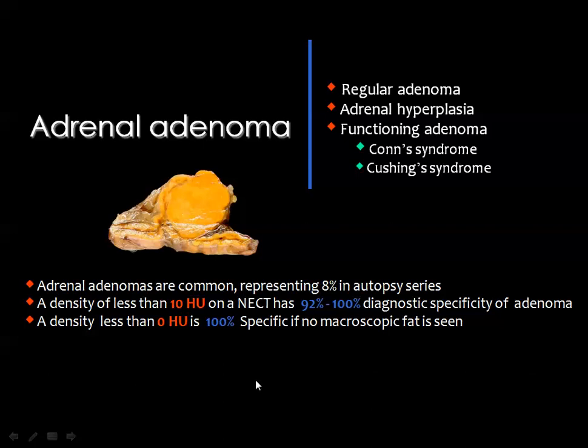It is stated in the literature that, in order to be sure that you are diagnosing a lipid-rich adenoma, a density of less than 10 Hounsfield units on the pre-contrast CT images has a diagnostic specificity reaching about 100%.